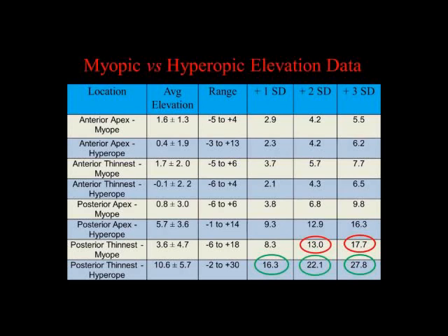So why did we put on a separate normative database for hyperopes? And this is the reason. And really, the only change is on the posterior elevation data.